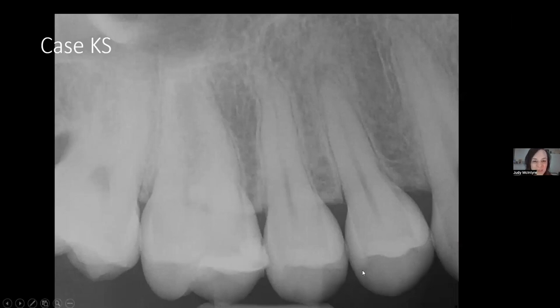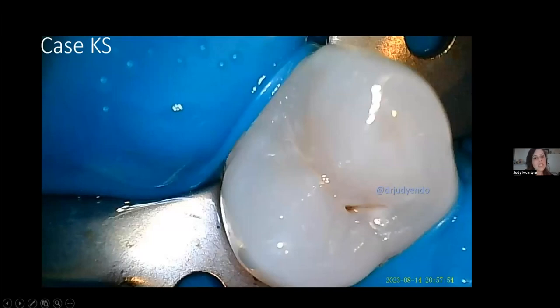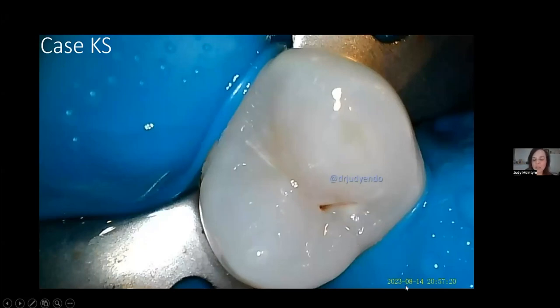So again, back to these virgin teeth that keep on cracking and necrosing. We look at this and we see good horizontal bone, and this might be a little overlapped. Maybe there's something here, but I would say that this is pretty difficult to interpret, which is why 2D is limited. There might be a small periapical lucency here, but again, it's a virgin tooth. My referring dentist was completely incredulous, rightly so. Clinically, nothing. Maybe a small craze line here, maybe some decay, but transillumination actually showed through and through. Not very impressive. What's going on?